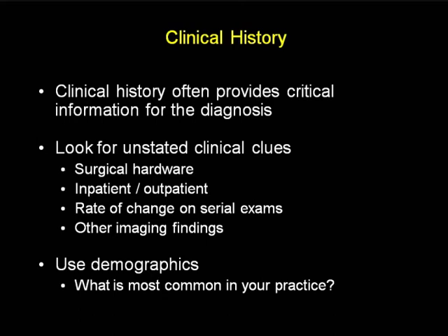Is the patient an inpatient or an outpatient? Look at the rate of change on serial exams, and other imaging findings that might add specificity to the pleural effusion or the pleural process that you recognize. Also remember to use demographics. What's most common in your practice? The things that you find are most often going to be the things that are common. But let's look at some examples here.